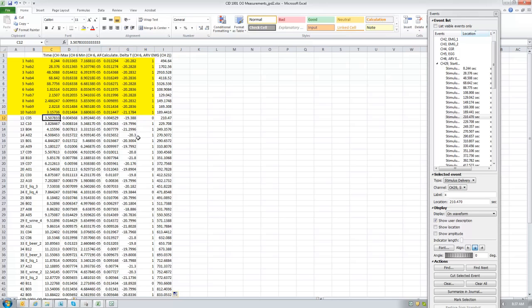I'm actually going to make sure I don't use any of this data that has a 0 next to it, and I'm going to put some X's so it can't calculate what my actual values are. I don't do it by mistake.